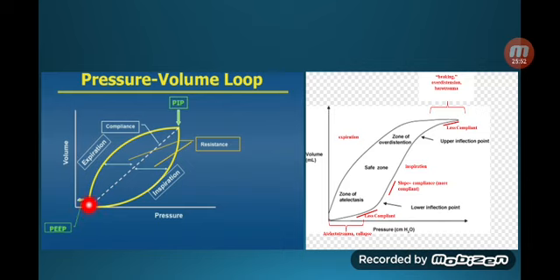And the breath starts from here going anti-clockwise, because we're having positive pressure ventilation, right? So this is the inspiration limb. You can notice that you give some pressure, but the change of the volume is minimal. This is because, again, the initial bit of the breath is against resistance.